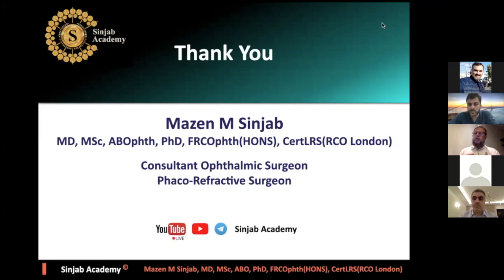Now, if we plan for cross-linking and for the customized laser vision correction, some people may say we have to do cross-linking first, wait 6 months, and then do the customized laser vision correction. Some people say no, we can do both together. I did both treatments, and I found that doing cross-linking first and waiting for 6 months is much better, because when we do the cross-linking, we give a chance for the cross-linking to flatten the cornea and get rid of some of the irregular astigmatism. Then we can decide for the gentle touch.